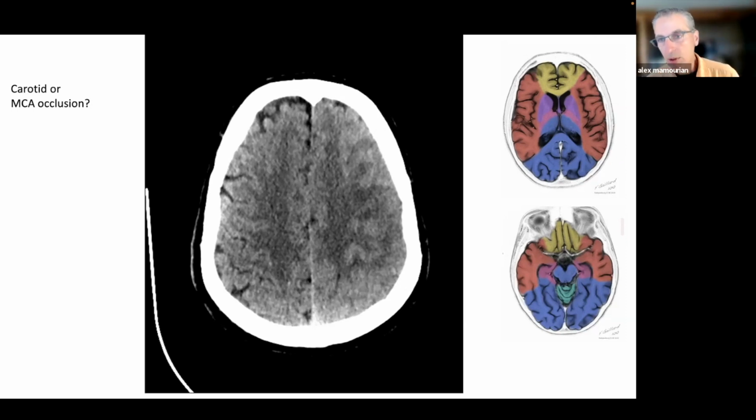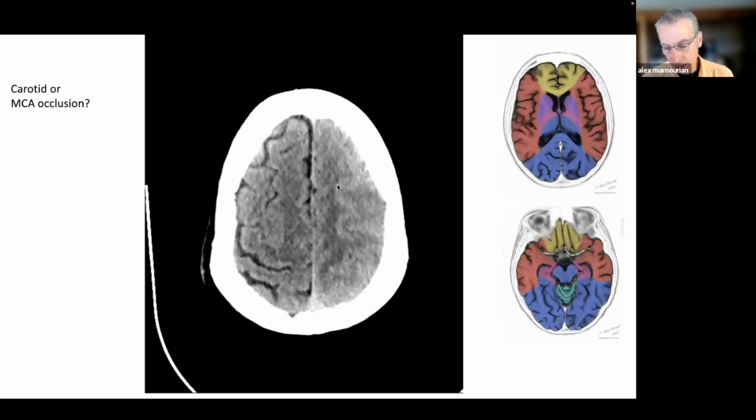I will tell you in cases that have gone to intervention, it's very common in patients who have a thrombus in the T junction or even in the proximal M1 segment that occasionally you'll see emboli that go out the anterior cerebral territory. You can have some little infarcts in the ACA territory post-intervention.